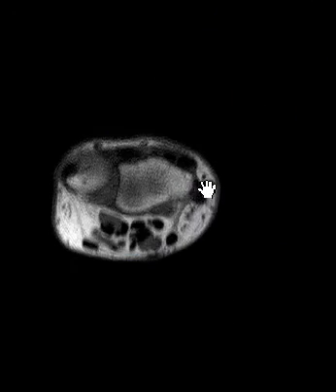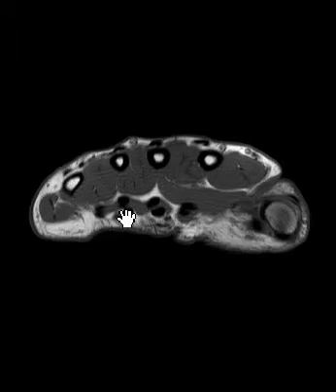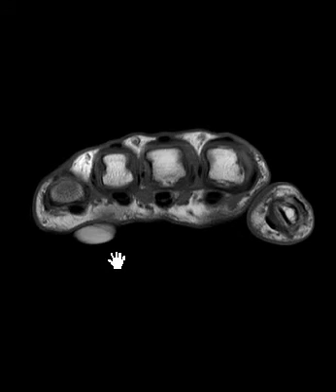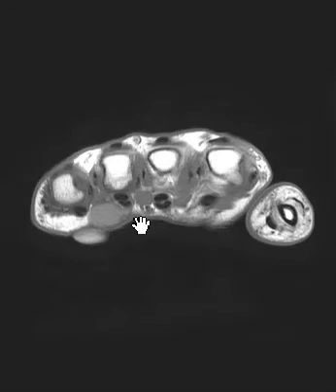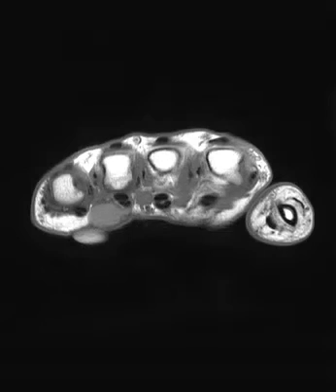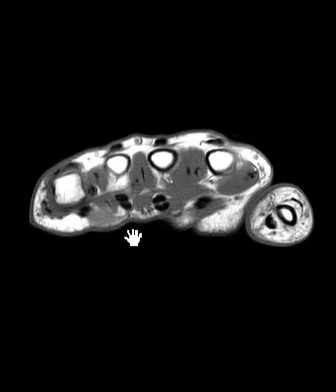If we put up these short axis images like this, we're going to go into it. Here's the fifth and fourth metacarpal bones. We're going to go distally, and there it is. This is that skin marker. These are the flexor tendons. We can see this is right between the fourth and fifth flexor tendons. Here it is. It's confined to the subcutaneous space here within the fat, and it's bulging the skin.